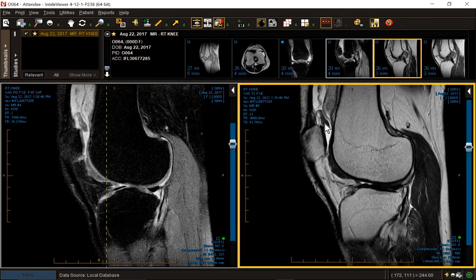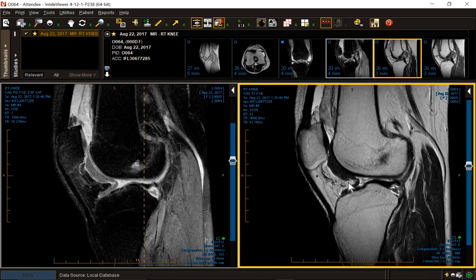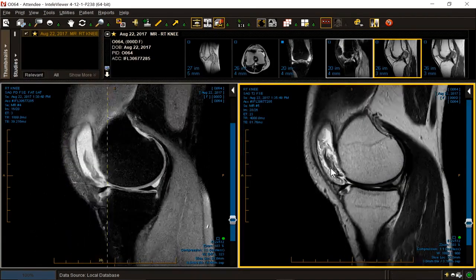So can we call this synovium? And the answer is no. Synovium is gray. This is too dark. There's been no trauma. The patient has a swollen knee. It's monoarticular. It's multifocal. In fact, some of it down here is adherent to the front of the femur. It's also anteromedial.